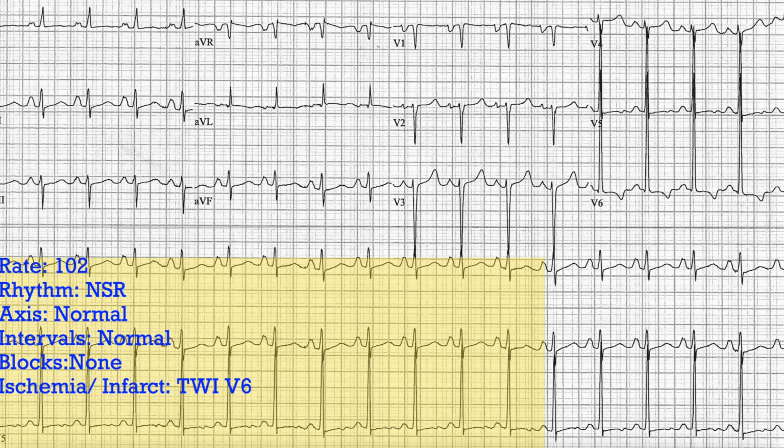Well, if you had a big stiff ventricle, i.e. LVH, then blood has a hard time getting into it and backs up into the atria, which are thin and stretchy, and that causes them to dilate. So if you've got a big, hypertrophic, poorly relaxing left ventricle, you might expect to see some atrial enlargement behind it.